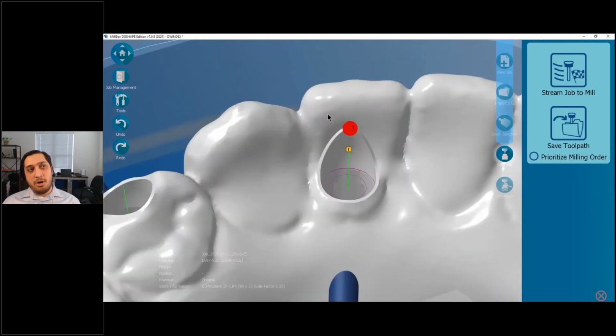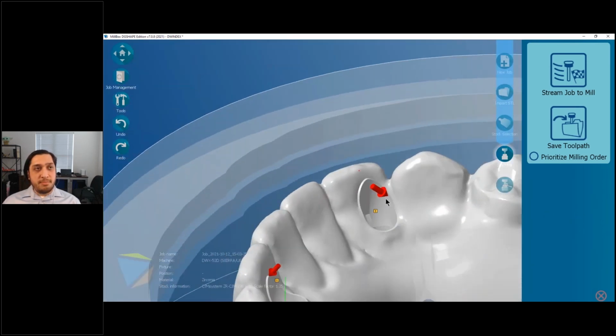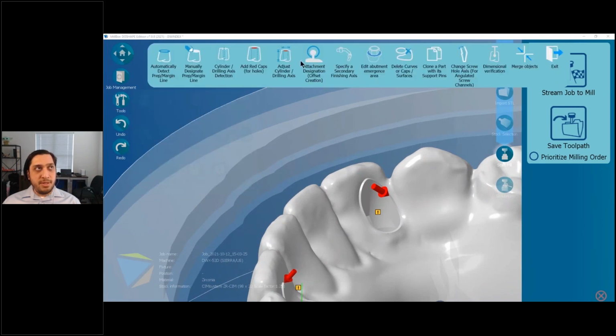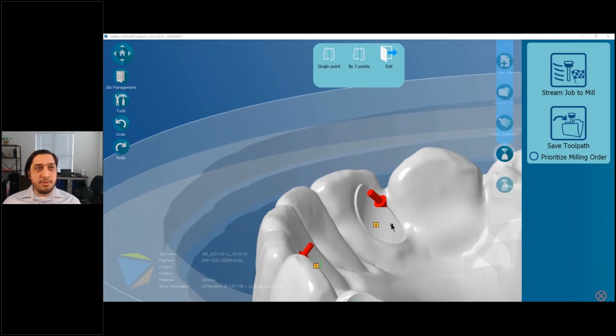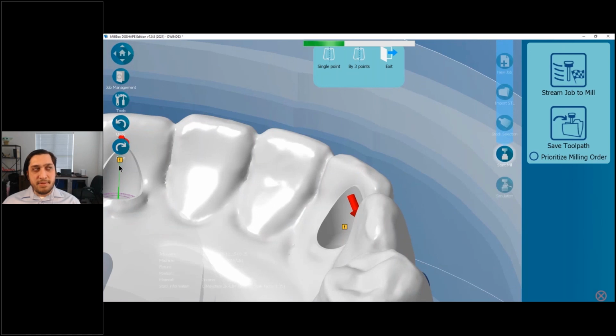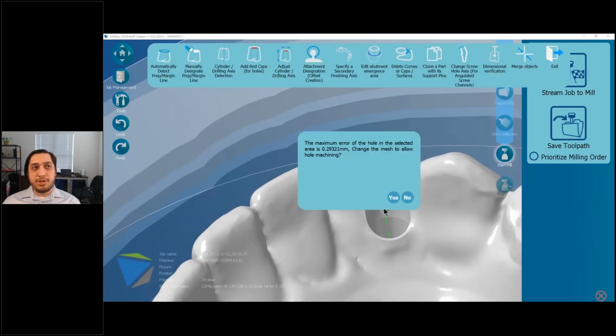Okay, so I'll move on to the next one, but just to show you here, the main problems that you used to run into, where it was completely irreconcilable, can now, for the most part, be fixed. Now this was working earlier. I tested this particular one, and I may have to adjust the drilling axis and come back in and try to re-fix that mesh again.